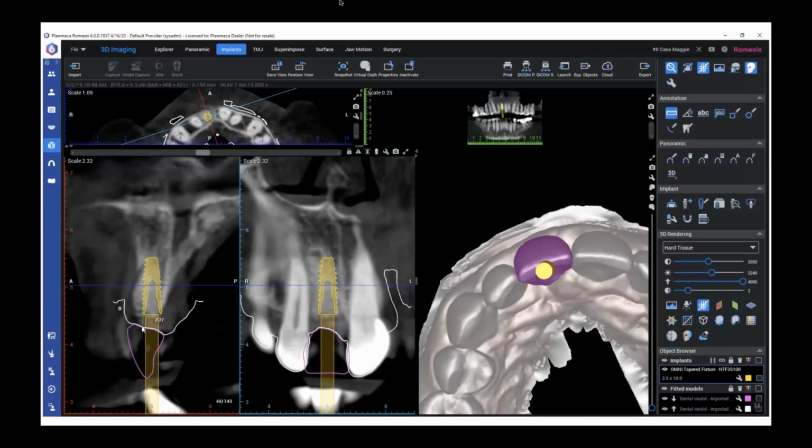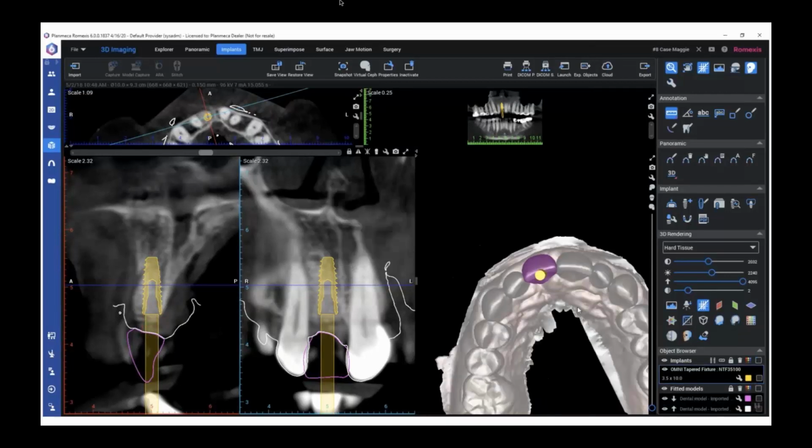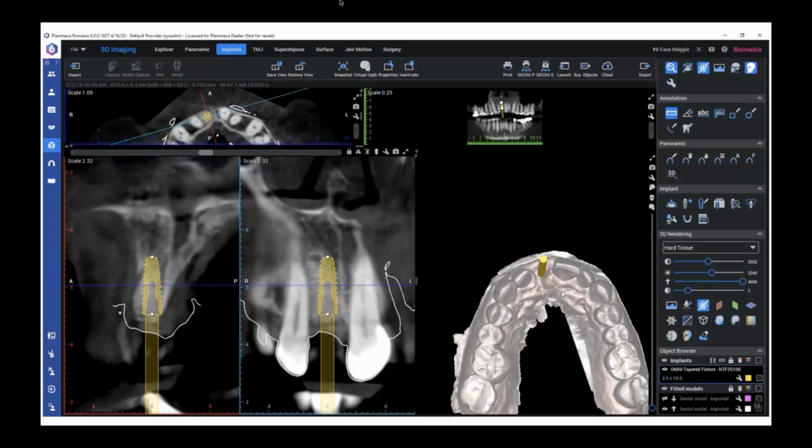One rookie mistake that I find that our residents do all the time is there's this tendency to place the implant platform at the crest of the bone. But in this case, you know, we're 2 millimeters away from where the future gingival margin is going to be, absolutely not adequate in the anterior. We need to go ahead and drop that implant a little bit, right? And we can remeasure it to make sure that we're happy about the depth. So slightly subcrestal. That is where having an idea of where that gingival margin truly needs to exist is critical. With a stock tooth, library tooth, we may miss out on that landmark, and therefore you may not get the perfect implant depth.